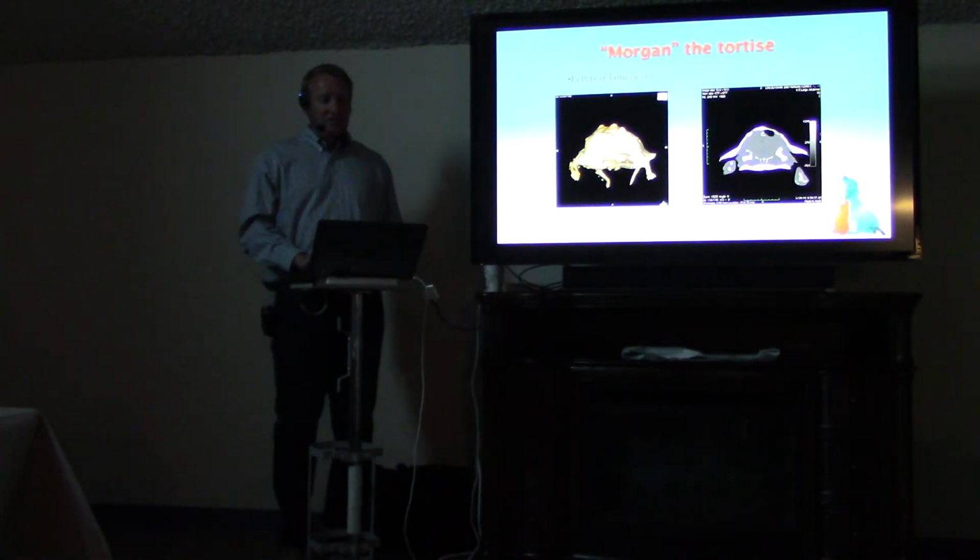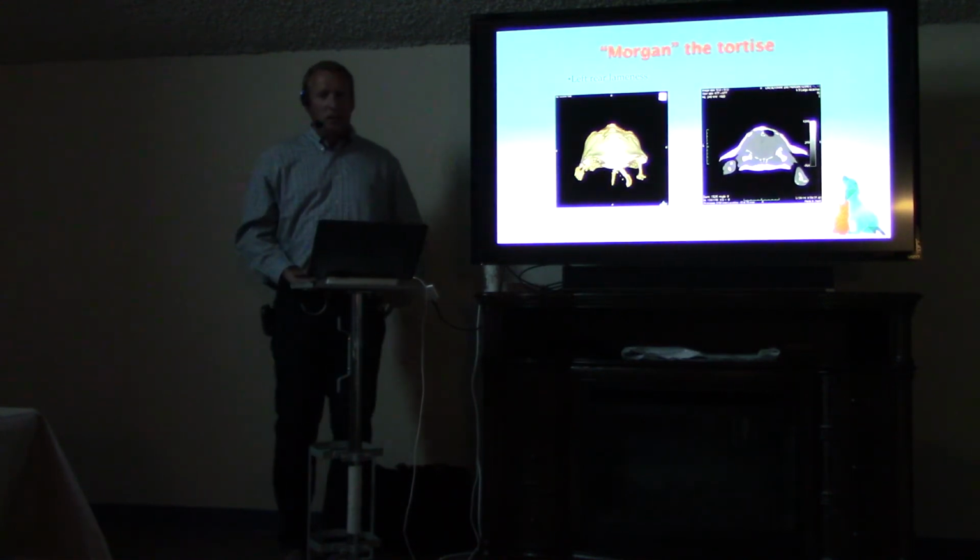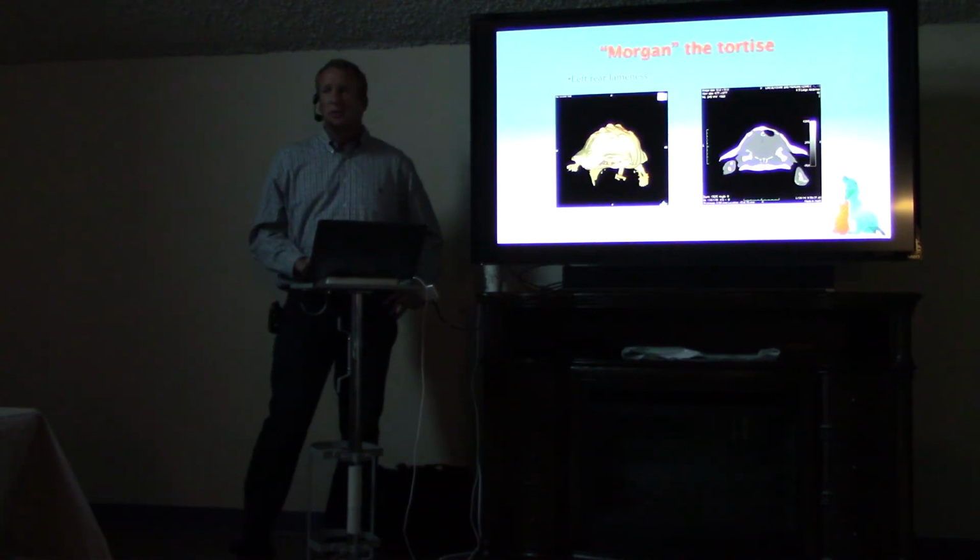That's really all I have. This is just kind of a fun case. When I was in Chicago, I used to get a call every once in a while from Dr. Catherine Gamble, who is the head veterinarian at Lincoln Park Zoo, and she would ask me if I could help image one of their residents, and so I got to help out with some interesting studies doing that.